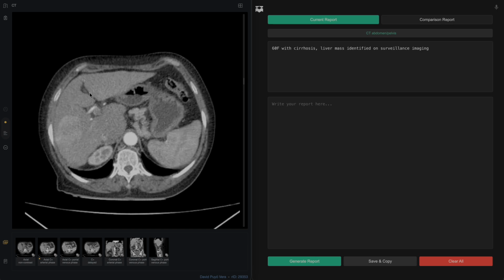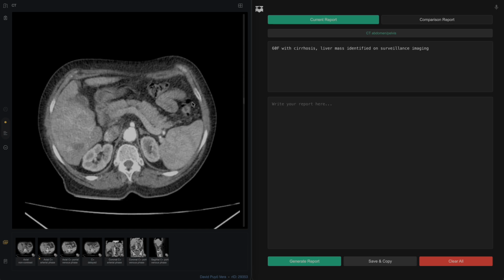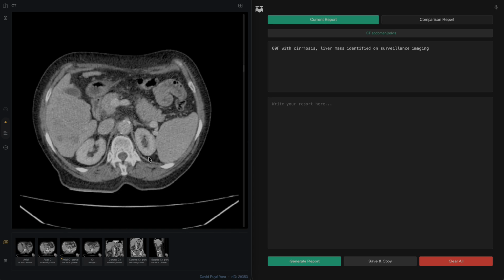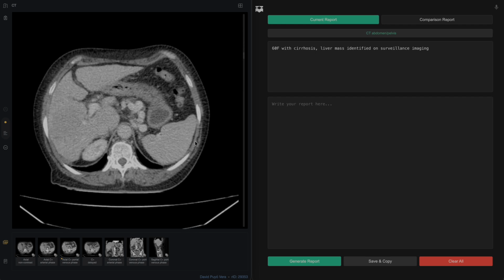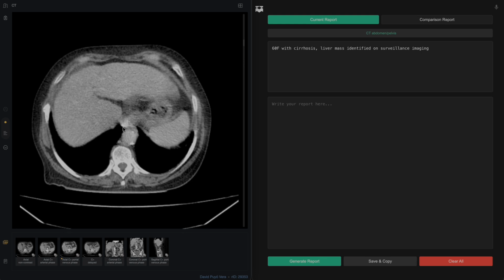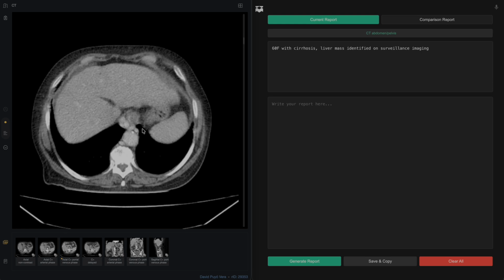And let's have a look at the rest of our liver, see if there's any other lesions. Generally looks okay. We can look at our portal venous phase images. This is a good opportunity to look at the rest of the abdomen. We can see the patient has splenomegaly, large looking spleen, and we can see all these prominent vascular structures here just lying behind the stomach. And those are typically appearing varices, and we can see they come up here to lie around the outside of the distal esophagus as well.